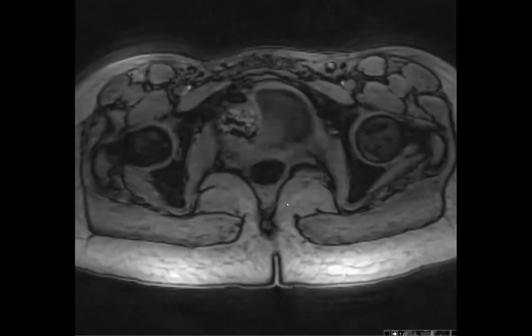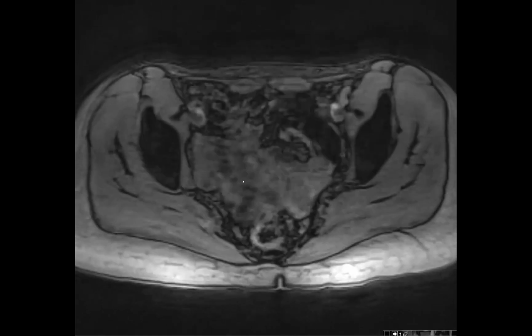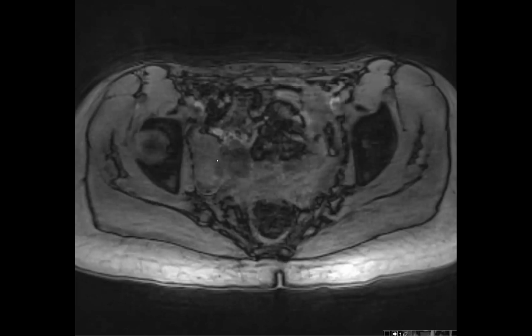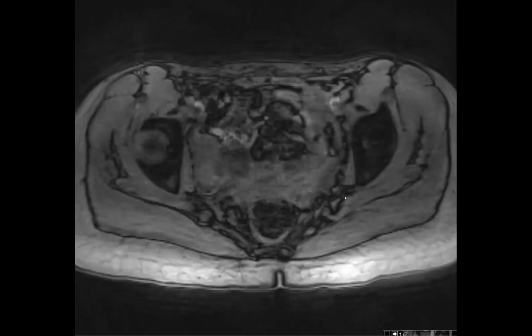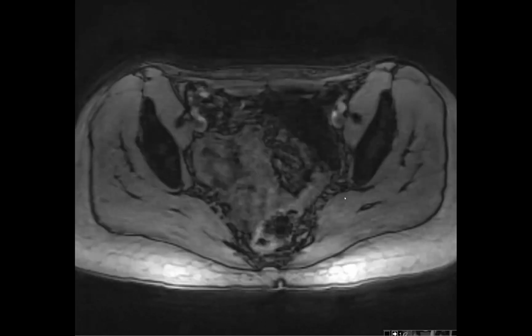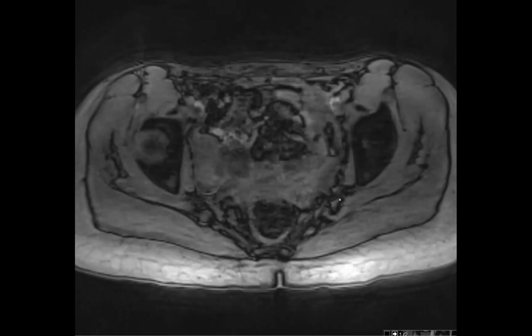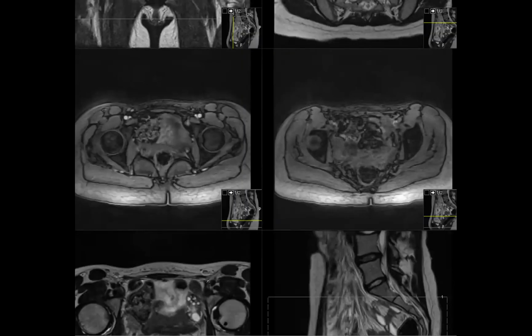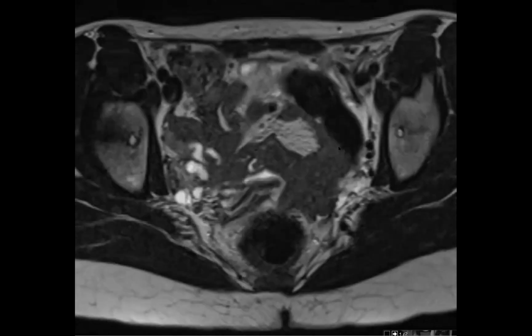This is the T1. So that structure is right there on the left and right here on the right. Why did you ask for the T1s? I just wanted to know if there were, I mean, it sounds like it's congenital absence of the uterus, and there's that eponym that Steve alluded to, which I can't remember, but just making sure it's not something else.